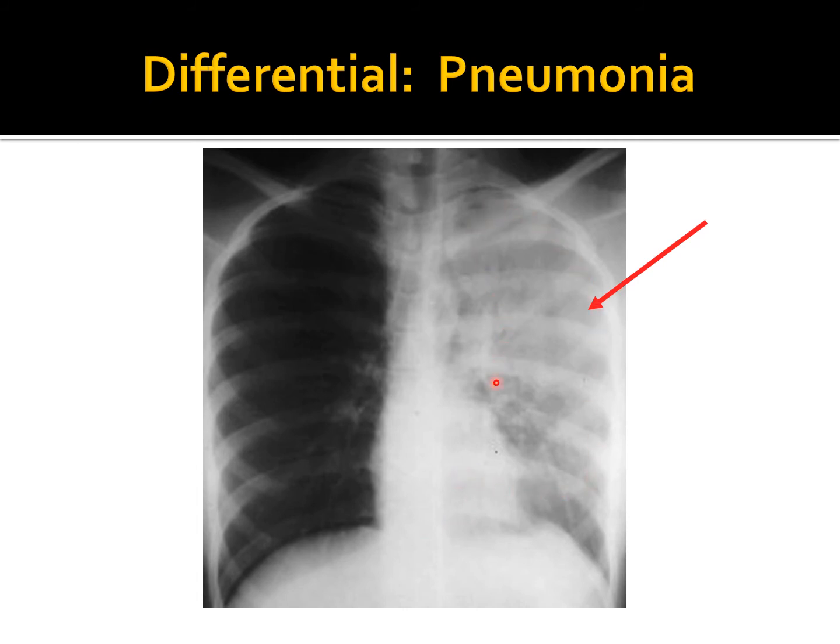The other thing here is that through the density, you may see lucencies, which are air contained in the normal bronchioles of the lungs. Usually in pneumonia, your infiltrates are in the alveoli, but the bronchial trees, unless it is extensive, will not contain pneumonic infiltrates.